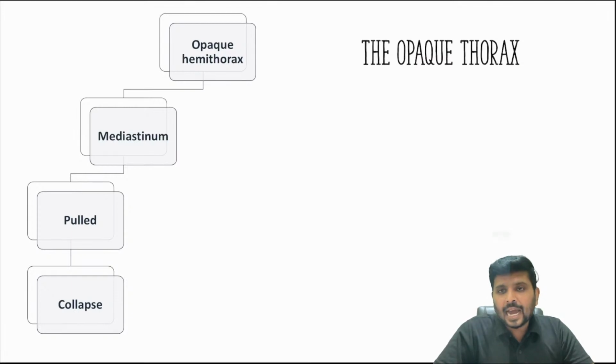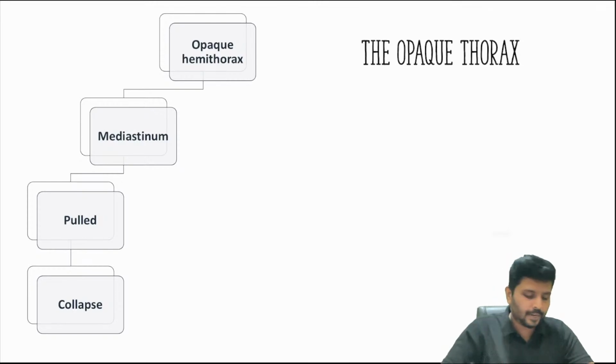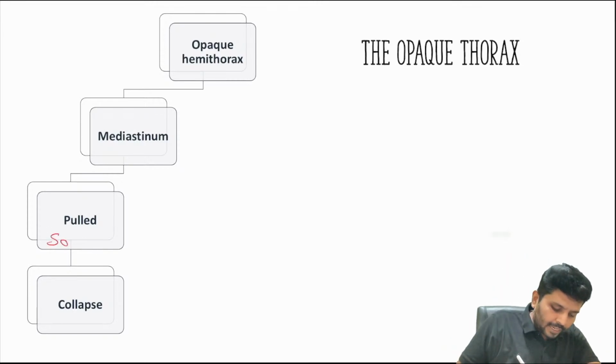So when all air is replaced by nothing, the lung volume will become shrunken, and you will get white out hemithorax, either involving all lobes or some particular lobes, leading to mediastinal shift. Your trachea will be shifted to the same side. I repeat, your trachea will be shifted to the same side.